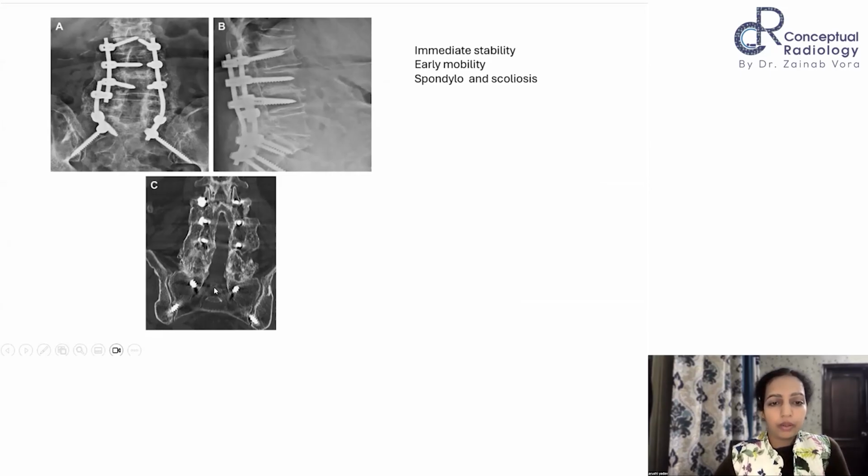And in the midline, what you're able to appreciate is a complete laminectomy, non-visualization of the spinous processes of these vertebrae, and new osseous bone formation, which is a good sign, a positive sign of this fixation. That is, we are close to the aim of fixating with a construct. So this all collectively is known as a stability construct, right?